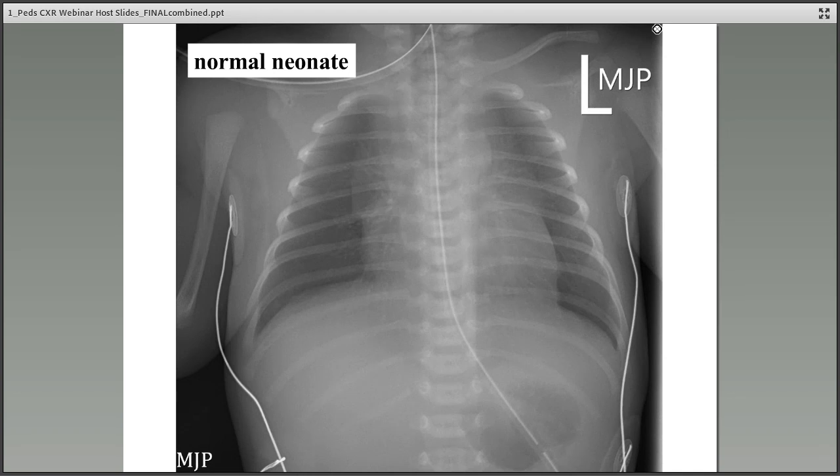As mentioned, the thymus is enlarged in the infant. The thymus has different morphology in the infant. In this case, the thymus is a bilobed structure, and it is symmetric, as outlined here.